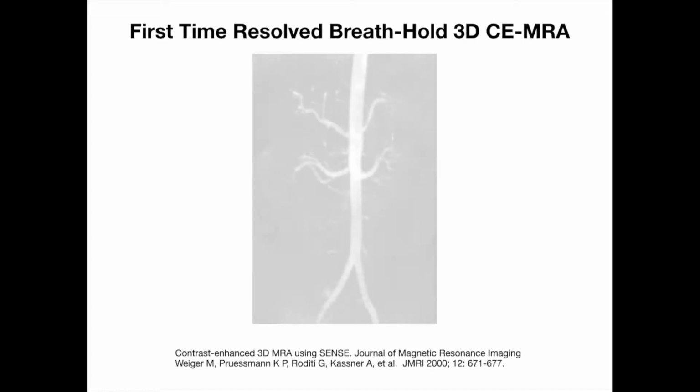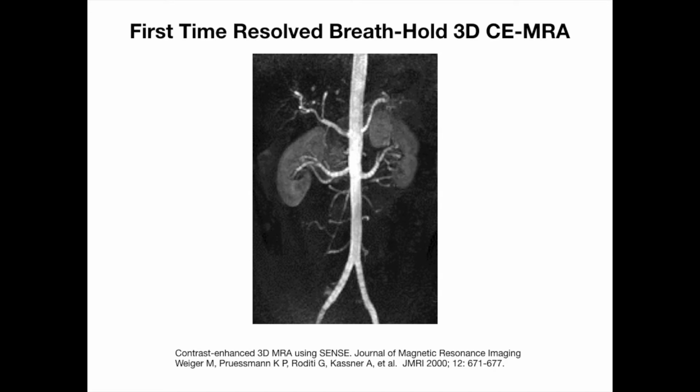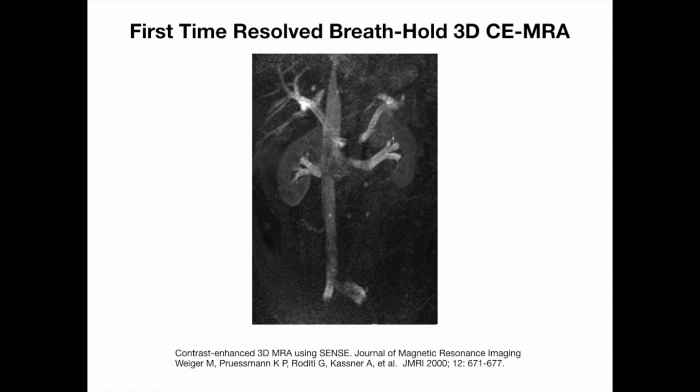This is the world's first time-resolved breath-hold 3D contrast-enhanced MRA that I know of. And I say I know of it because this is the arterial phase. This is the later arterial phase where there's parenchymal enhancement. This is an even later phase where there's early venous enhancement. And this is later, and this is pure venous first pass without arterial.